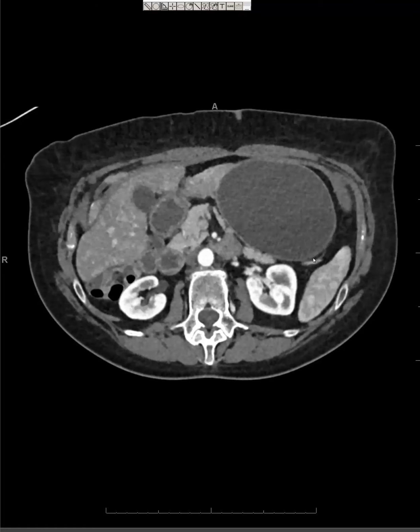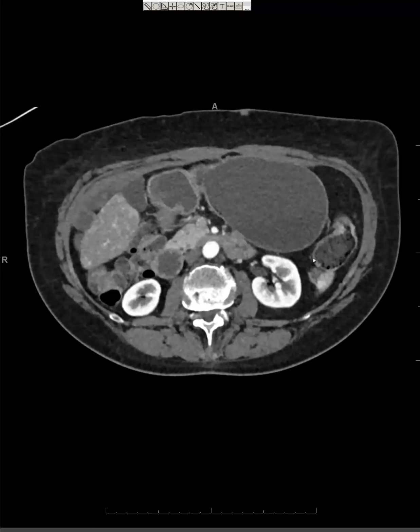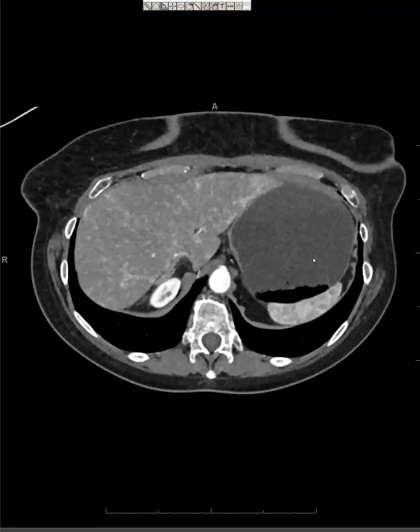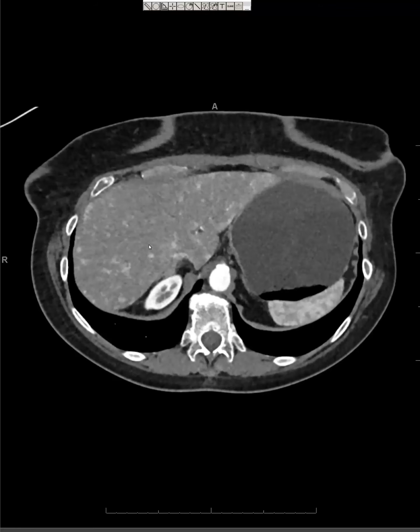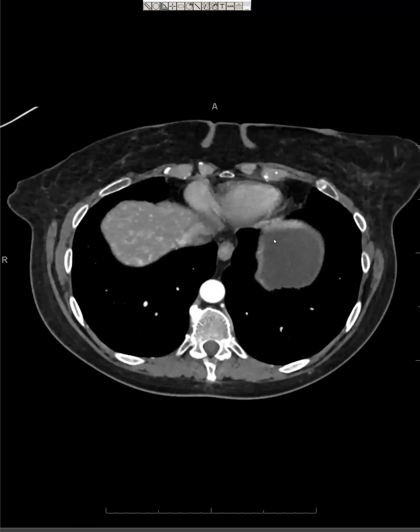So I can't stump you guys, but anyway, if you Google HHT images of liver, a lot of them look a lot like this. Some of them are even worse, with bigger vessels than the biggest here, which is probably this one.